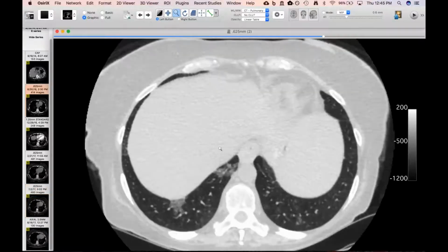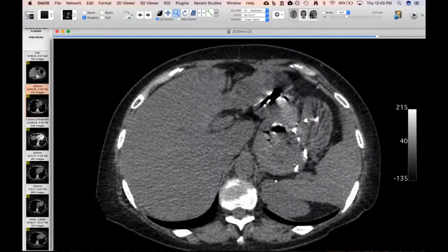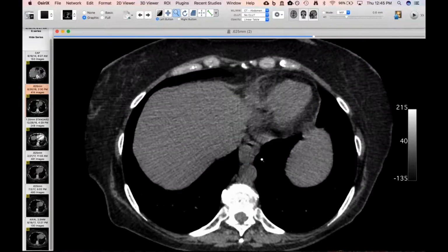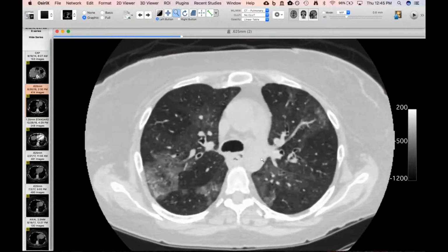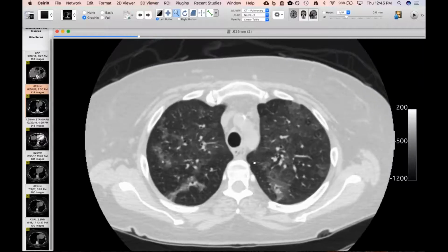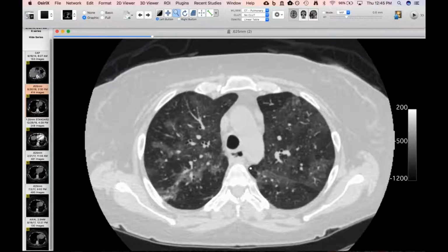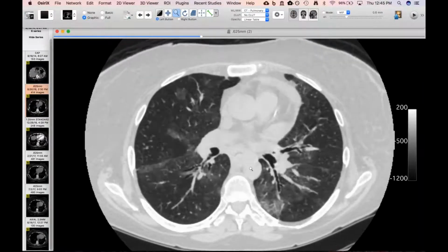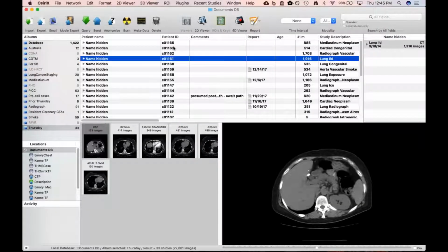Yeah. And that's one of the things I brought up too, the fact that she'd had a gastric bypass, and I wonder if this contributed to it. But it's an interesting case. I think it's just a reminder not to forget about aspiration. Right there, Travis, you can see actual food in the esophagus. Yeah. Wow. All right. Very kinetic. I'll show one more just really quick.